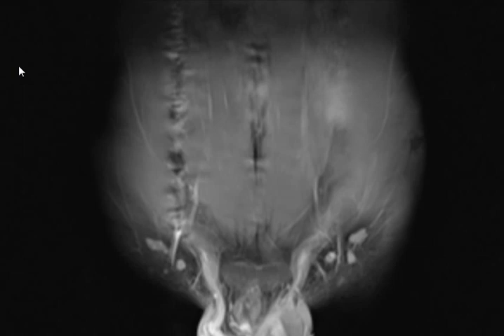The history of the patient: hip pain, just pain. Negative past medical history, negative past surgical history, no trauma, okay? The thing is, the radiologist who reported the case somewhere else is one of the people that I think are very good radiologists.